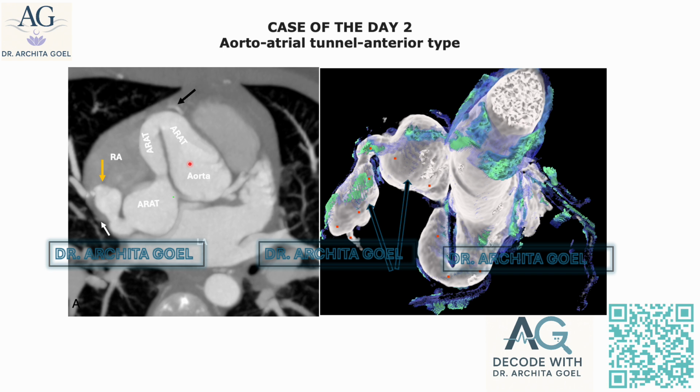The second differentiating point is to look for the myocardial branches. A vascular tunnel will not give rise to myocardial branches.